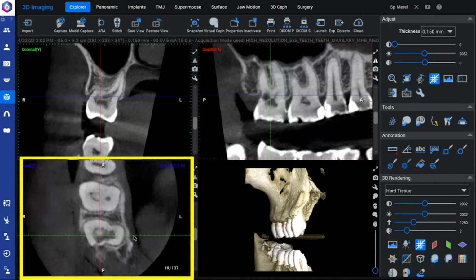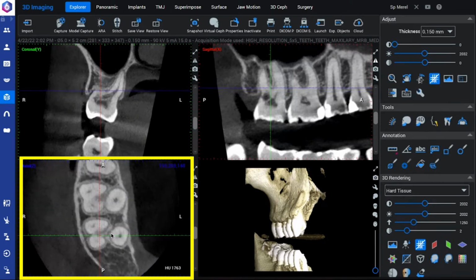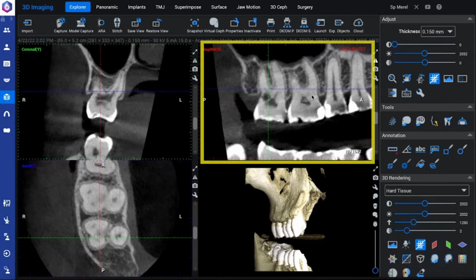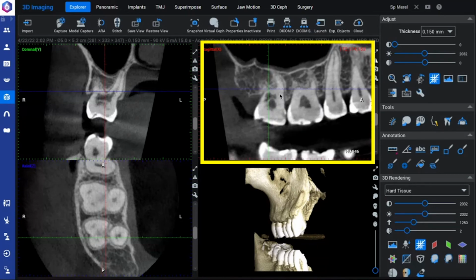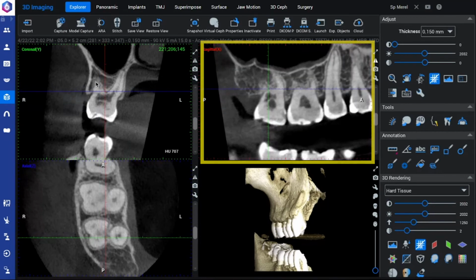It extends very deep into the palatal wall. So it's all the way down here, which means that by the time we remove it, there's not very much palatal root structure left. When there is that severe kind of extension of the resorption, that means that it's a little bit too extensive. So by the time we remove that resorption defect here on the lingual, we're extending all the way into almost the furcation areas and very deep into the tooth like that.